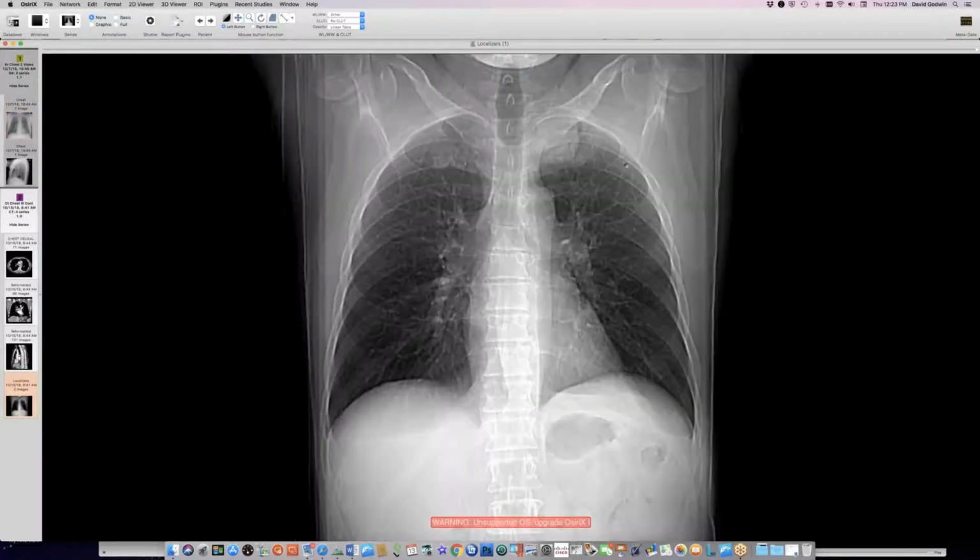I wish I had a chest radiograph. After motorcycle trauma in particular, I've seen pseudomeningoceles in this location from avulsed nerve sheath, you know, what do they call that? The sort of capsule around the nerve sheath fills with fluid, and you get a CSF collection up here, a very smooth CSF collection. There have been a couple of cases like that at Harborview in the old days.